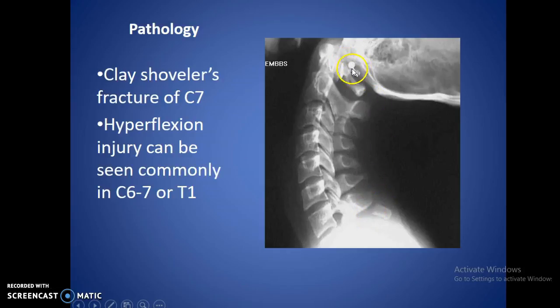Here, see little studs for earrings that were not taken off. You can see their relative location in relation to C1 on there. That's why the earrings do need to come off.